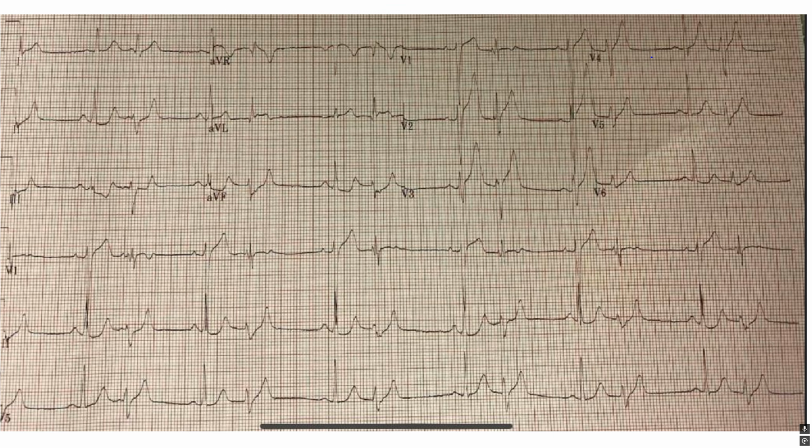Let's go through it. Again, where are you guys practicing? Our scale's on point, but here we have a V1, a lead 2 and a V5. So PQRS, another PVC, PQRS. So we got bigeminy here. We got a normal beat followed by a PVC here.